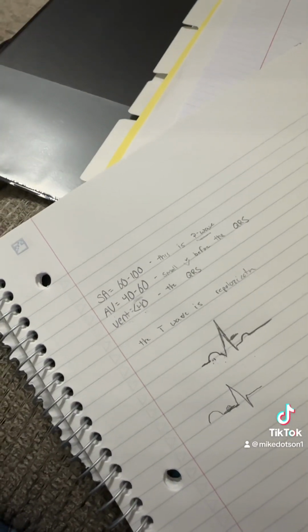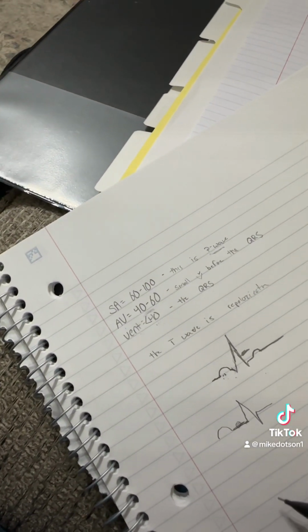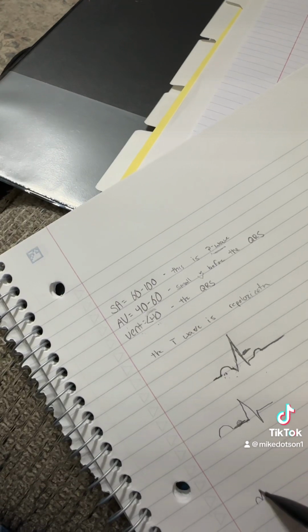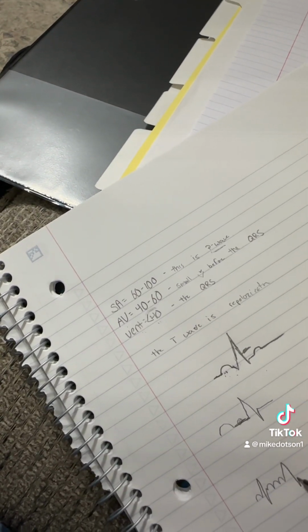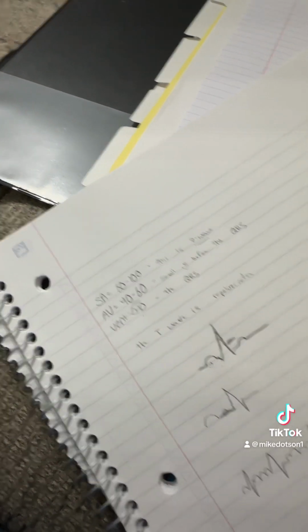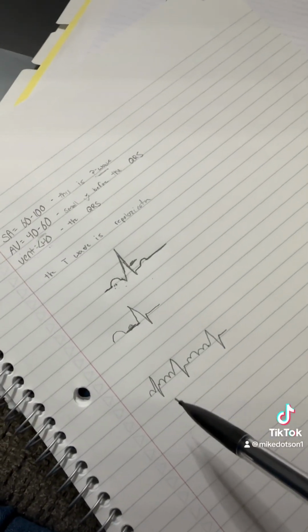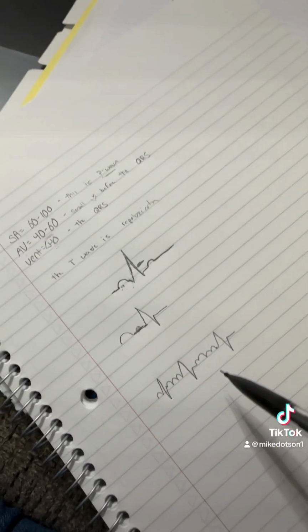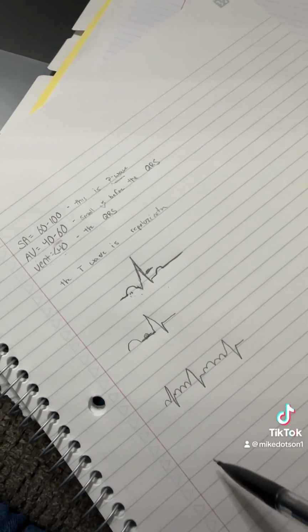The next atrial rhythm is the one that you'll see more than anything, and that's AFib. AFib is a bunch of P waves firing, and then a QRS. P waves, P waves, P waves, P waves, QRS. There's no rhyme or rhythm between it. This is irregular. So there's no rhyme or reason behind it. It's just a bunch of random firings.